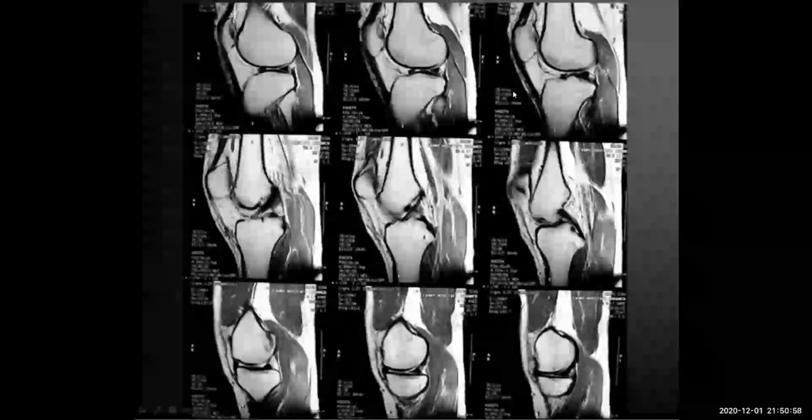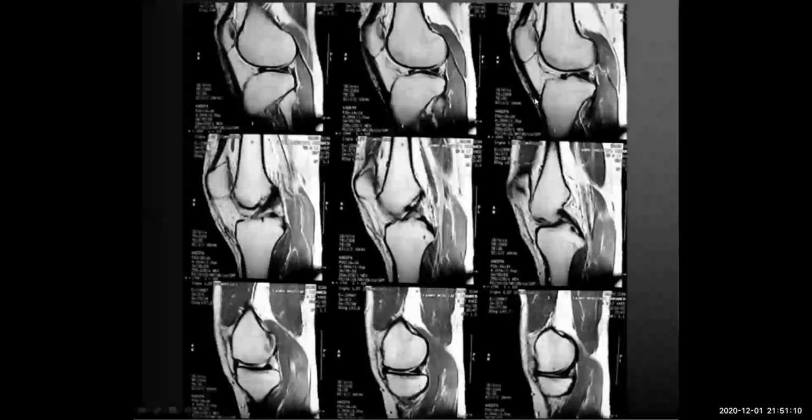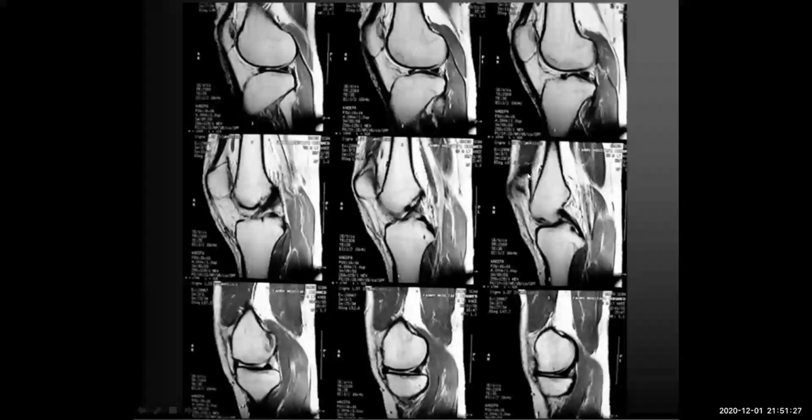So this is a plane, okay, like T1 is a kind of identification. Then you can read from these small busy letters here, okay, the orientation, whether it is right or left, or sometimes up here in the corner. Then you can identify the name of the patient, the date on which it's being done, and then you can go straight away to a systematic approach.